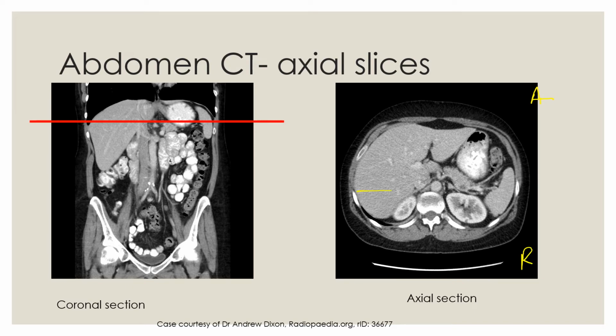Posteriorly in the retroperitoneum we have our kidneys here, the aorta here, and some of the pancreas. We have, as I mentioned, the spleen, the liver, and the stomach, which is full of contrast. We can also see our vertebral body here, and some ribs, but some ribs are cut out, because if you imagine we've cut through a slice of the patient, some ribs will be in view, some won't. All of the ribs won't be in complete profile.